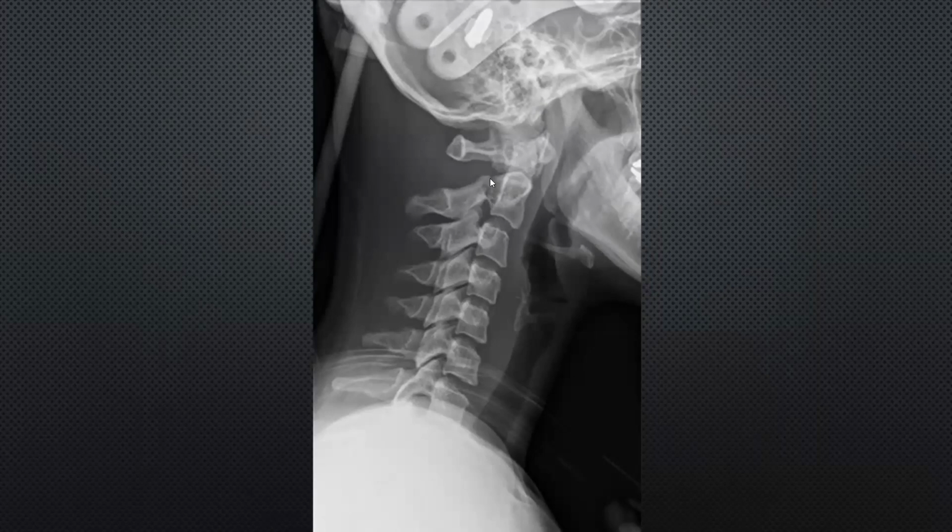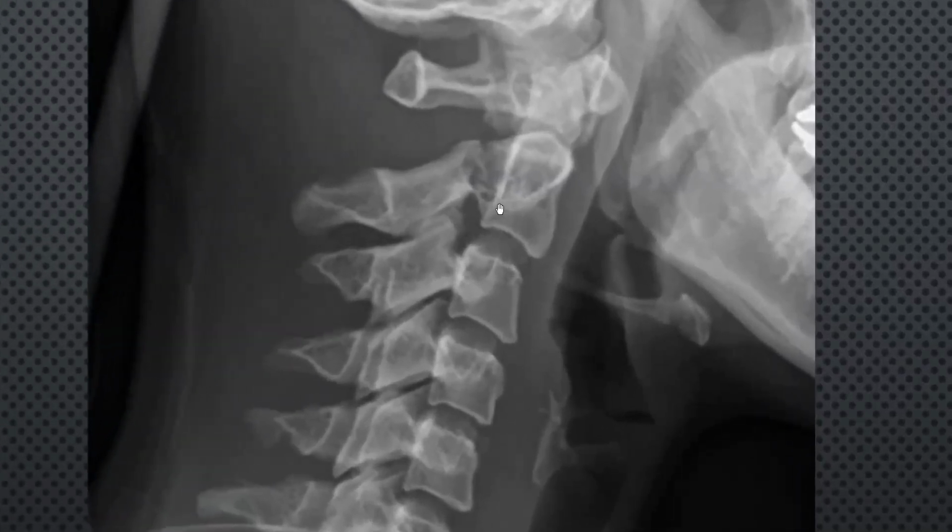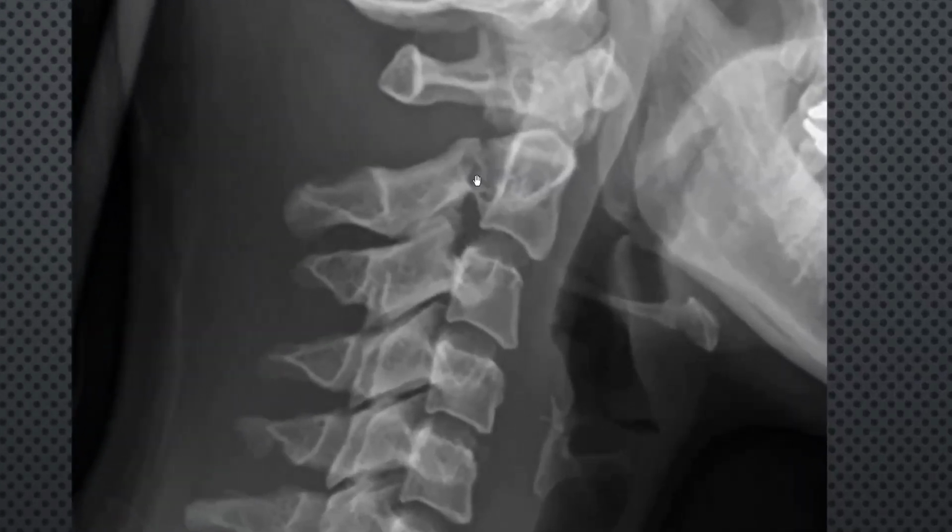Here, what is the fracture here? Sir, pedicle fracture. Hangman fracture. C1 or C2? Sir, C2. So it's called hangman fracture. Clear, doctor? Can you see the fracture here? You can zoom by 2 fingers in your phone. It's obvious here.